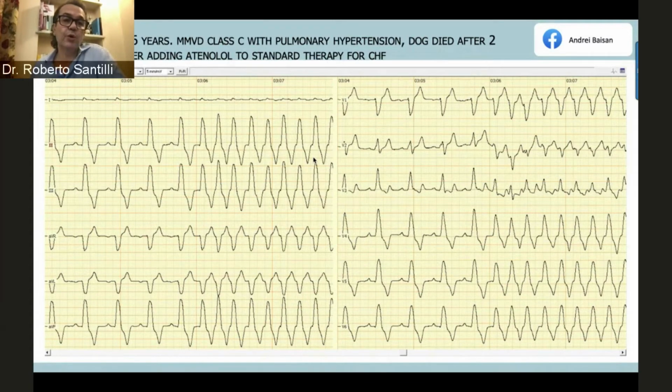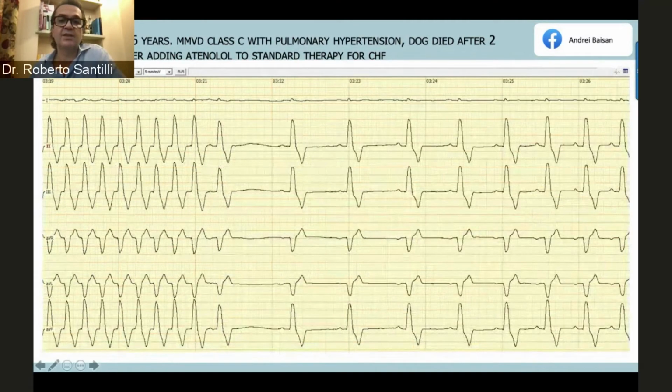My only worry is that when I have a complete or truncular left bundle branch block, you can induce more damage on the right bundle, and then you can induce a third-degree AV block. And this is how the tachycardia stops. As you can see, now you see tiny P waves, and then you go back to a normal sinus rhythm with the presence of a normal AV association.